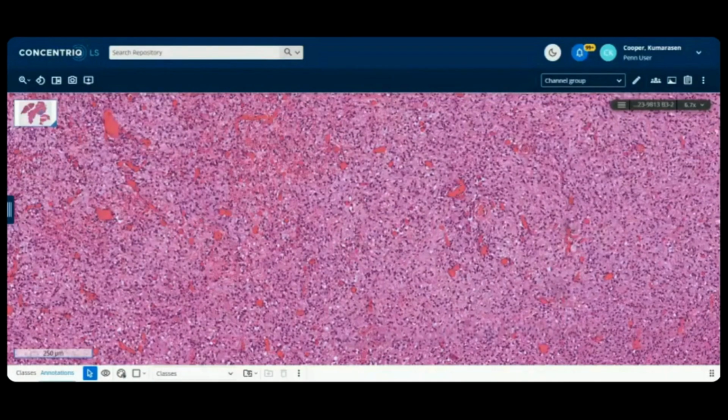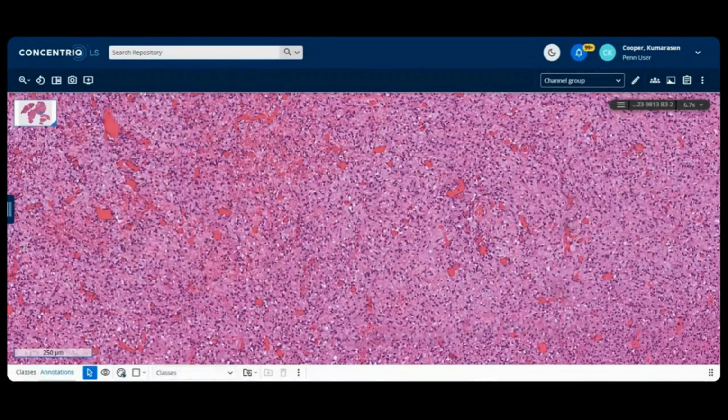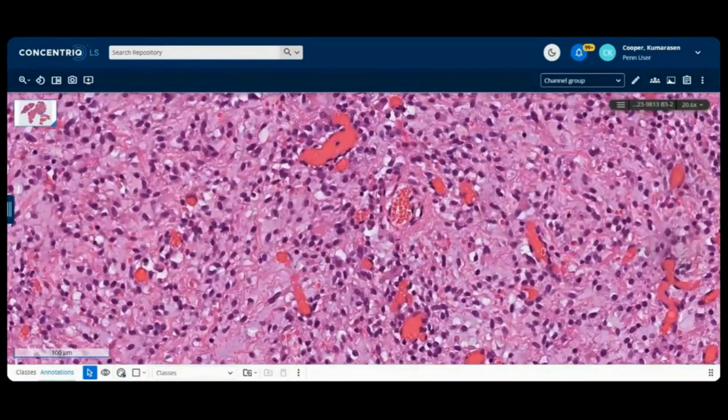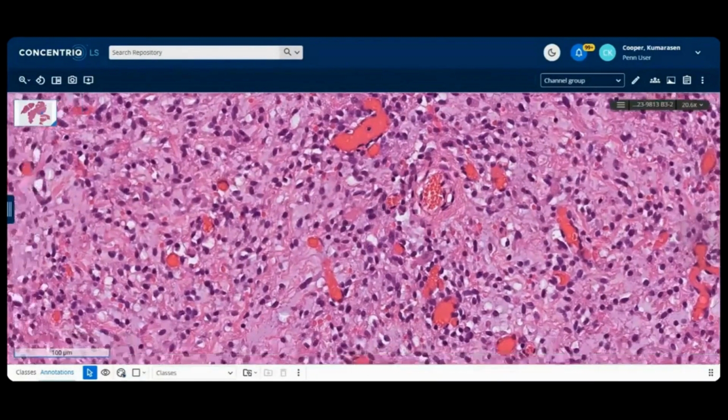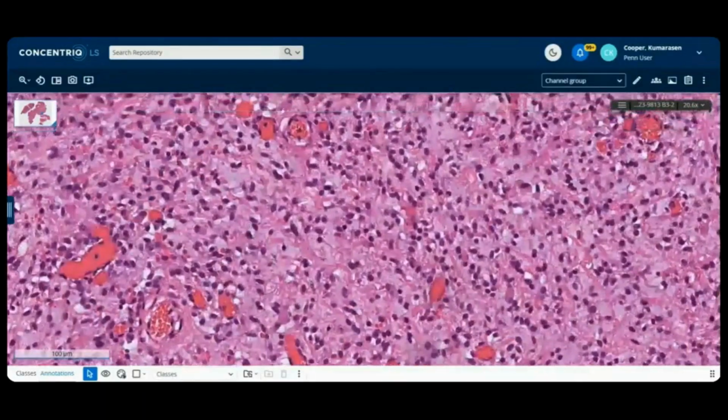What are we getting then? Any morphological clues? Yeah, okay. So a good example of that, where you go through a wide differential diagnosis, and the uniformity should help you subject it to sequencing. But CD34, S100, and then the collagen. I just saw this vessel here now. There's a little bit of collagen around here. I just saw that now. I was just looking for that helpful clue.